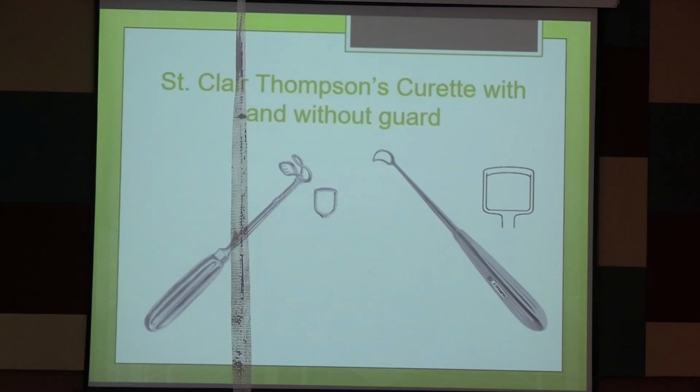So in exam you will be asked how to hold this instrument. First question will be to identify the instrument. Next question will be how to hold the instrument. Third question will be what are the uses of the instrument. The uses you tell, you will be asked the questions accordingly. Suppose you are telling tonsillectomy, then you will be asked about tonsillectomy, right?